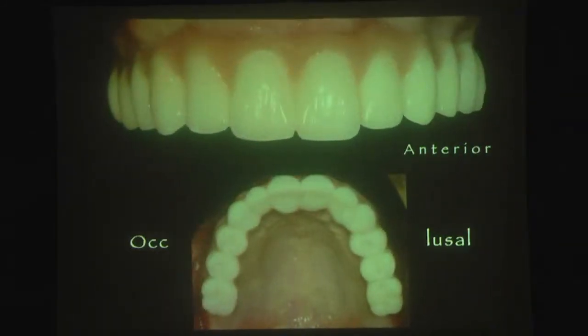And two views for the anterior position and the occlusal position. The patient was happy. Maybe you can see the white composite fillings here. They are the screw holes. Whenever she wants, it'll take only 5 or 10 minutes to take the prosthesis out. I will remove the composites, find the screw, and turn it back. Then I can take it out and do any fixation. So she came to my clinic this way, and I finished with this way.